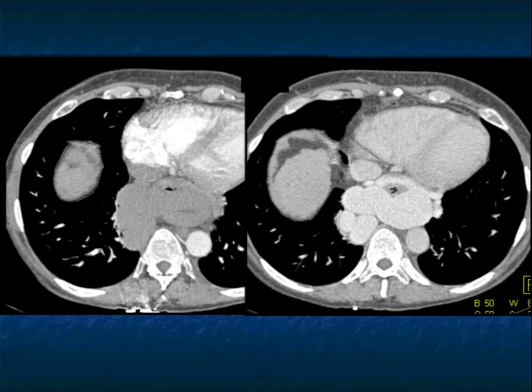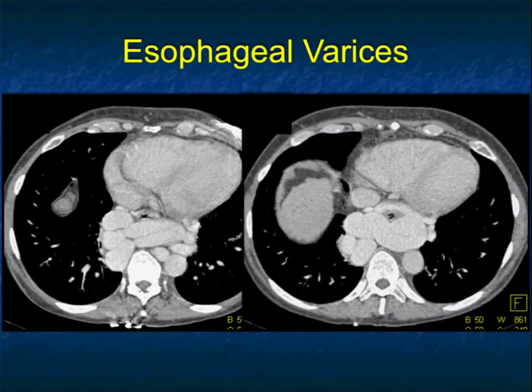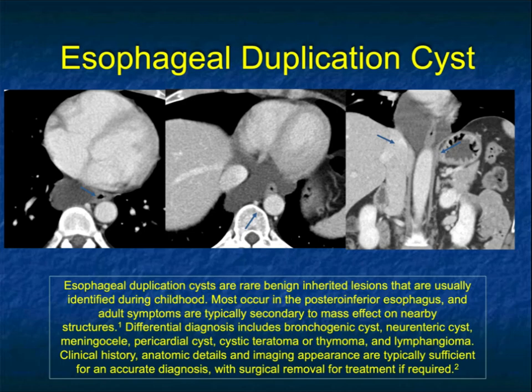So when I see a cirrhosis of the liver, I'm always cautious before I call adenopathy in the posterior mediastinum or adenopathy in the abdomen in general, because I'm always worried the patient may have varices. And you can see how extensive these varices are. And it's just a very impressive appearance, and you would hate to have someone scope for no reason. One of the reasons we like IV contrast in patients who have GI bleeding is because we can really evaluate the presence of esophageal varices, and when they're this extensive, it's not uncommon for the patients to have symptoms of GI bleeding.